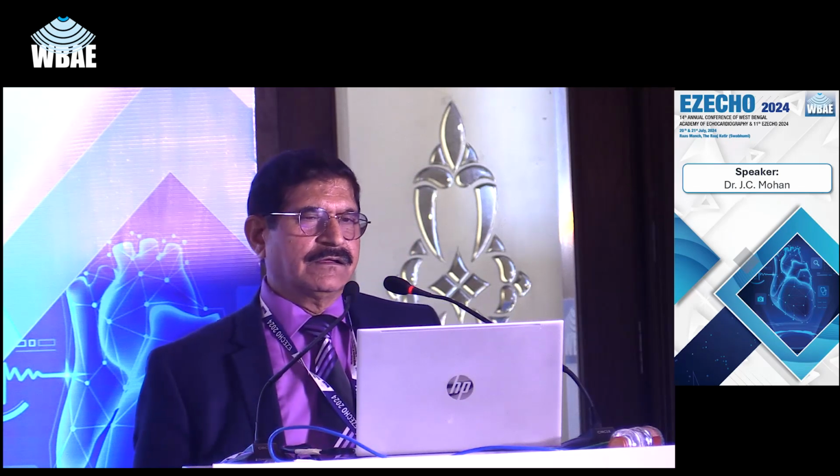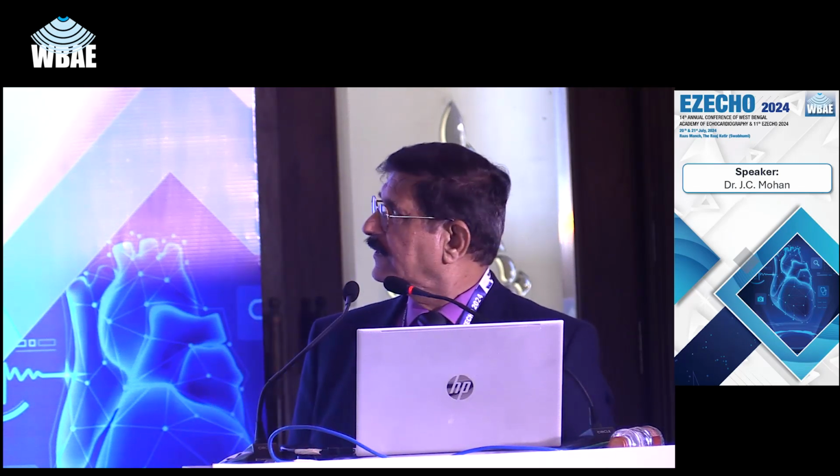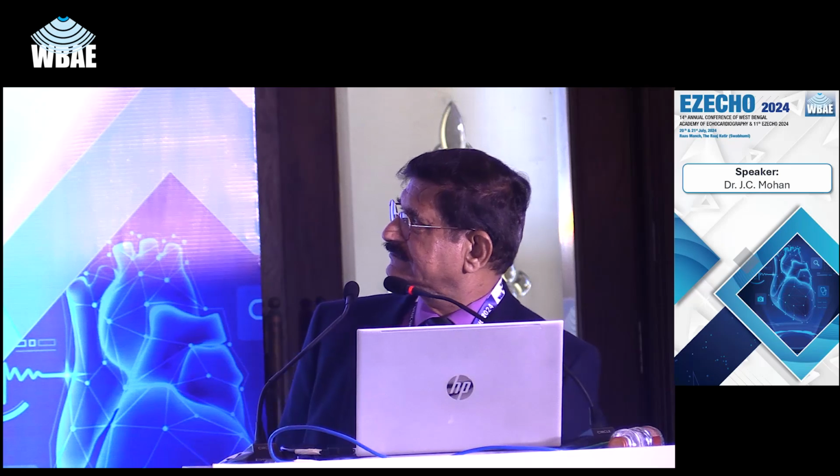Okay, here are the cine MRI images of the same patient.